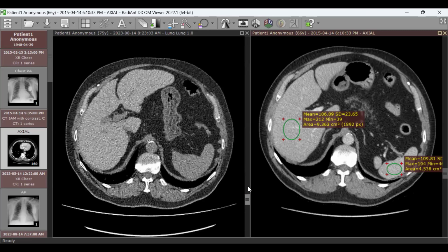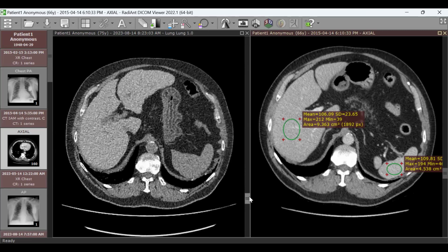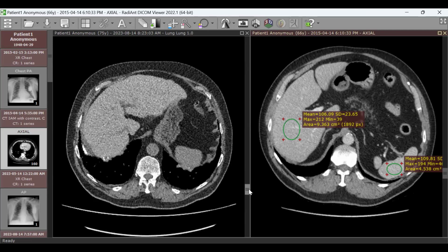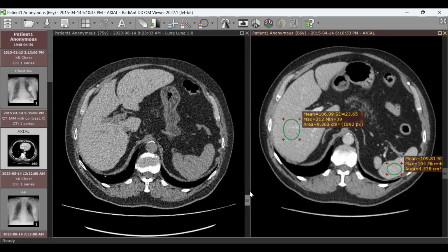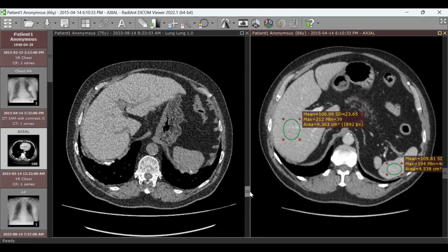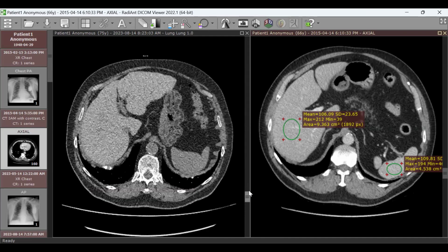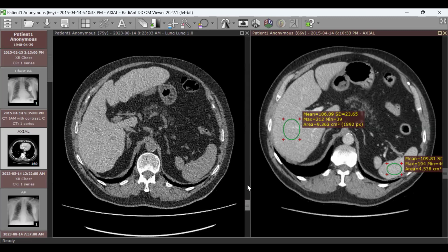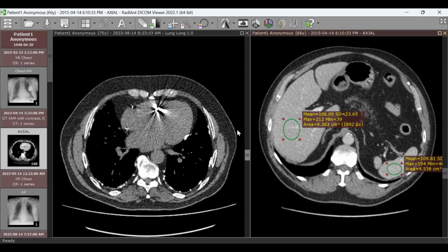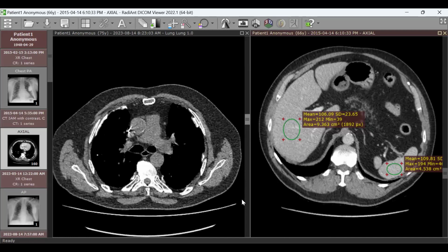But anyway, in this patient, they didn't mention anything about the liver, but now we have evidence that the patient has been taking amiodarone since 2015, 200 milligrams. After I made the report, I went and checked the record of the patient. I found out that he's been receiving amiodarone daily, 200 milligrams. And this cannot be ignored, and we cannot totally exclude the contribution of amiodarone toxicity to the appearance of the lungs and the fibrosis.